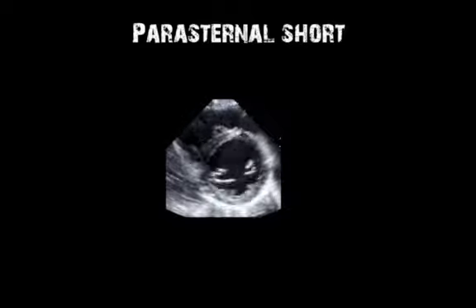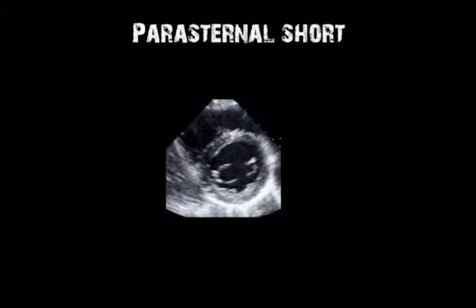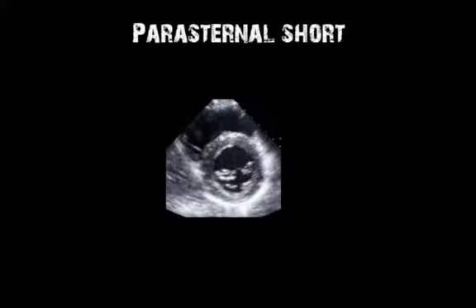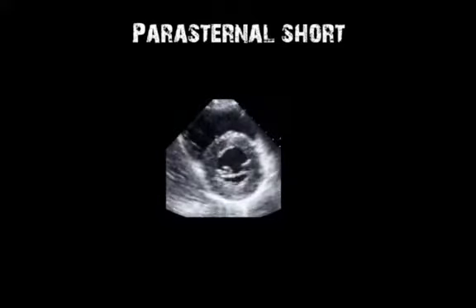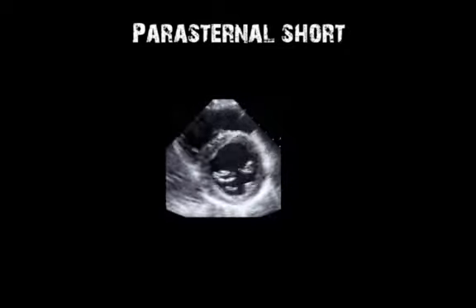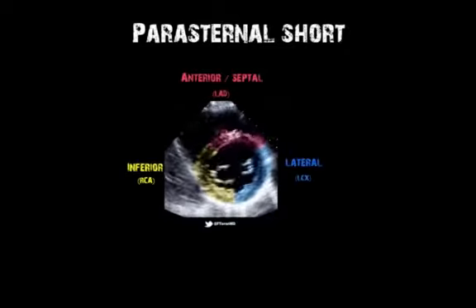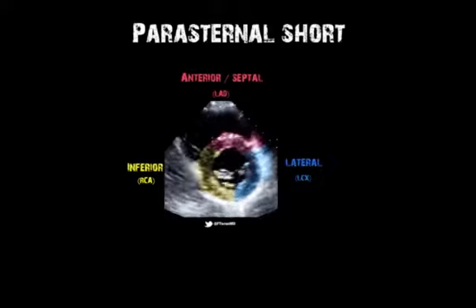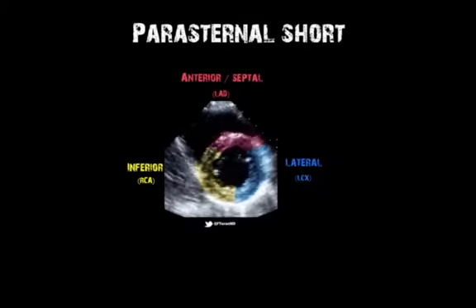Now to the video. Do you recognize each of the walls? Remember, this is a transverse section of the heart, so the right ventricle is on the top left of the image, and the region of the left ventricular wall that is closest to the probe corresponds to the anterior wall, while the inferior wall is seen on the left of the image and the lateral wall on the right of the image. Let's make this even more clear by adding color to the walls and reminding ourselves of the arteries that most likely are compromised when each of these walls or regions are affected.